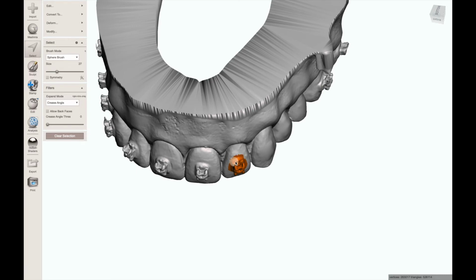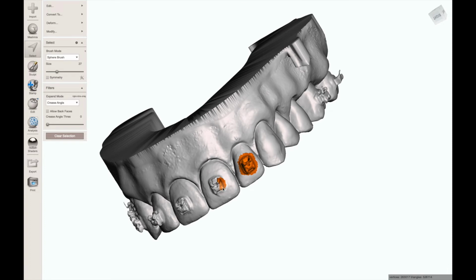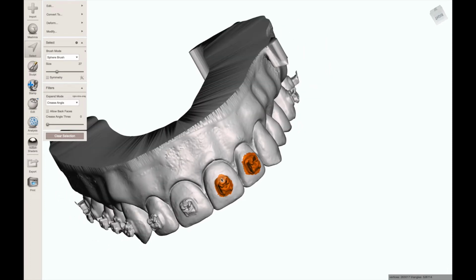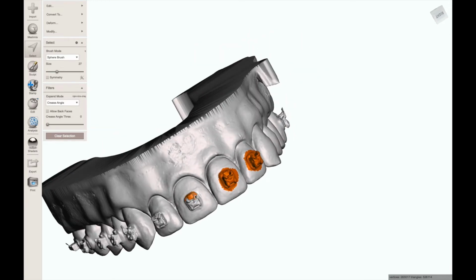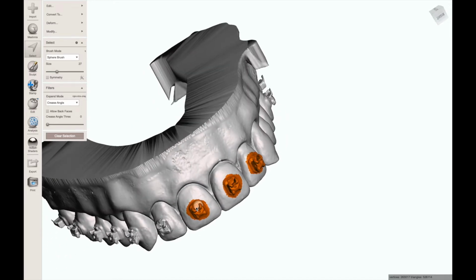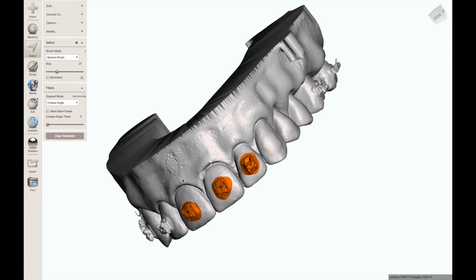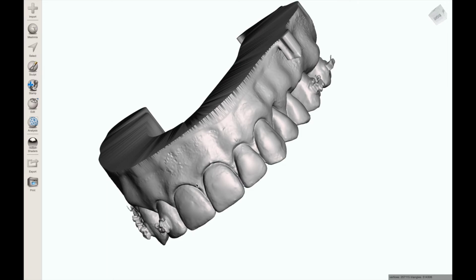By the way, I don't know if I've introduced you to the software. It's called Meshmixer. It's free software by Autodesk that a lot of dentists are using for 3D printing and bracket deletes and actually a whole bunch of stuff. So what we're doing is jumping from tooth to tooth to tooth, selecting the bracket. Now if you hit B, it'll smooth all those borders to have perfectly smooth surfaces, and then you hit F to erase and fill. There you go.